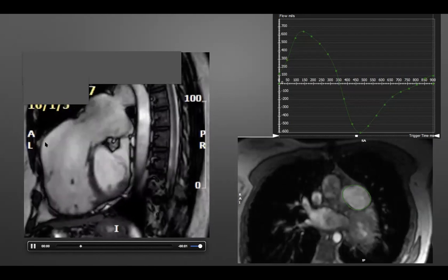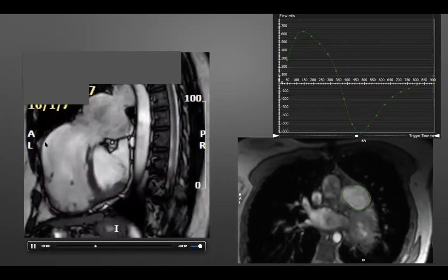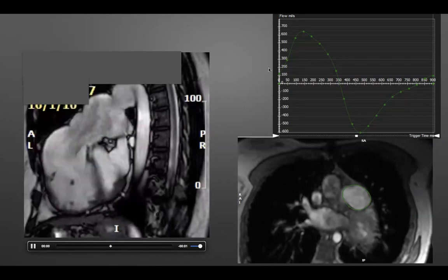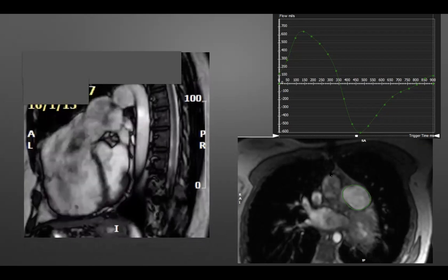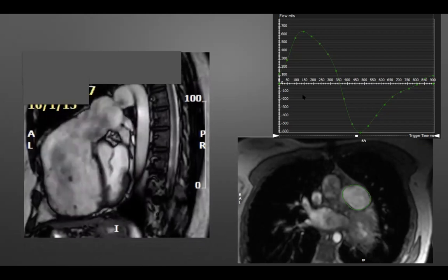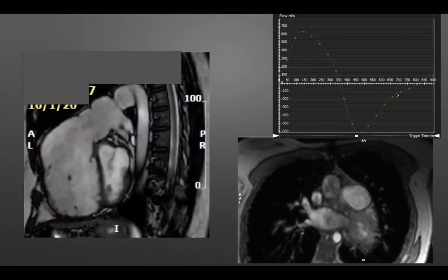This means that there is a transannular patch put in this patient during the time of surgery to augment the RV outflow tract. Here we are able to measure flow through the pulmonary artery, and just like continuous wave by echocardiography, by MRI you have this regurgitation volume, which is almost equal to the forward flow through that pulmonary valve.